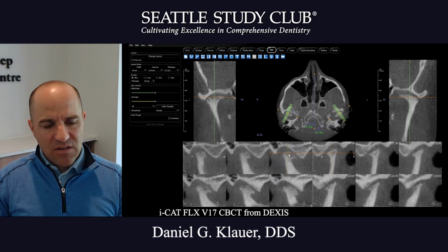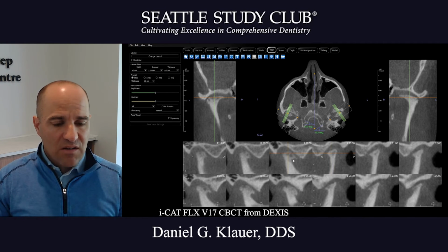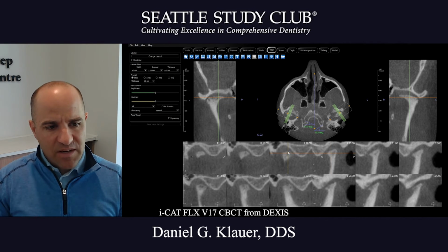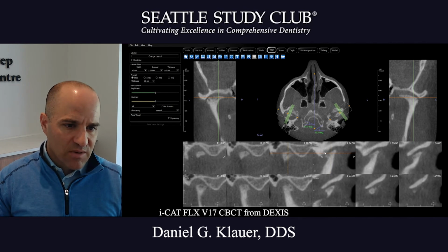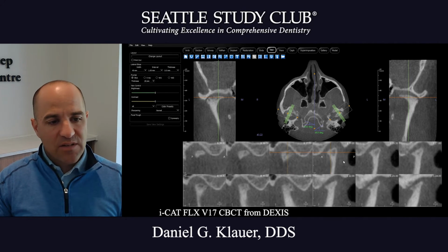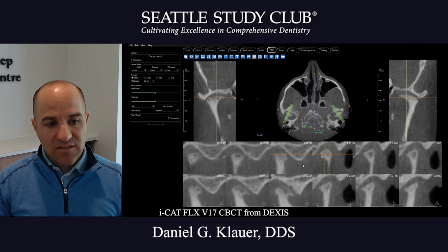So as you can tell here, there's a subchondral cyst, there's severe sclerotic changes of the condyle, loss of joint space, and pretty significant in a 36-year-old male to see these changes. And then we can evaluate the articular eminence as well. And here the articular eminence on the left looks okay. Some sclerosis as we get to the lateral aspect, and then a severe loss of condylar height as well in that region. So looking at the condyles from these different dimensions gives us a lot of insight.